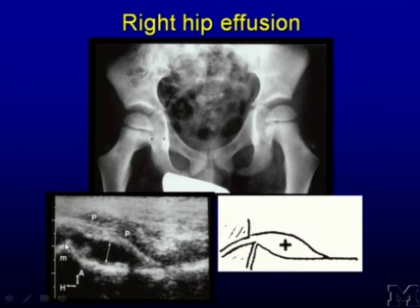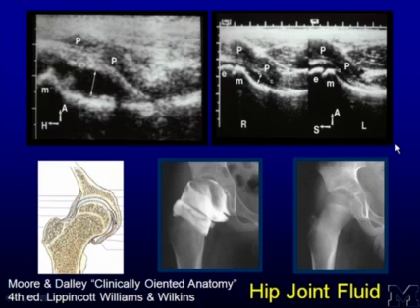This is a radiograph of this hip. There's quite a large effusion here. This is the psoas draped over the joint. And yet on the radiograph, maybe there's minimal widening of the space, but that's not a very reliable sign. We've had prominent effusions where on the radiograph you just couldn't tell. On an arthrogram, you can see how the femoral neck extends and how the joint capsule extends down over the femoral neck. Here's a big effusion. Here's a small effusion, in contrast to the normal side here, and P represents the psoas muscle on all of these.